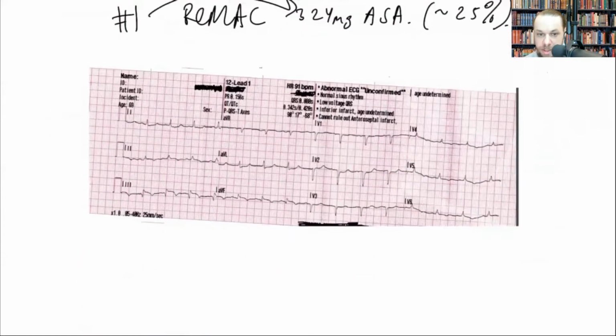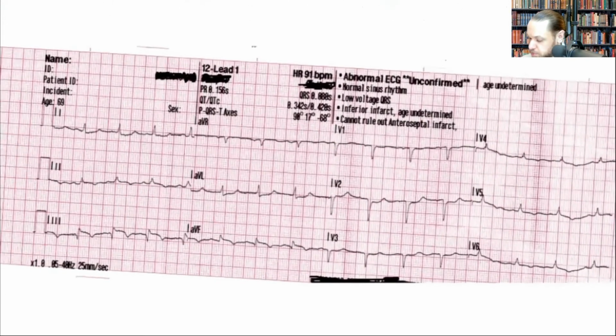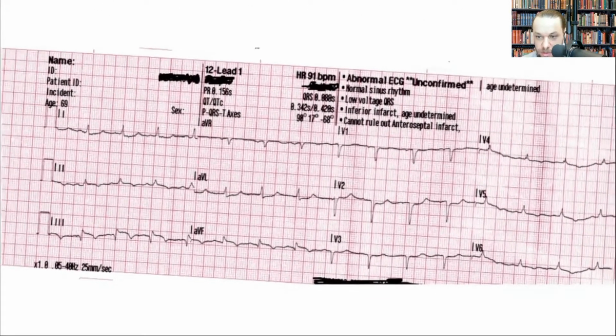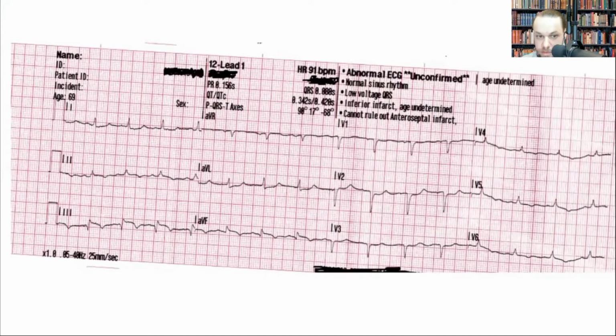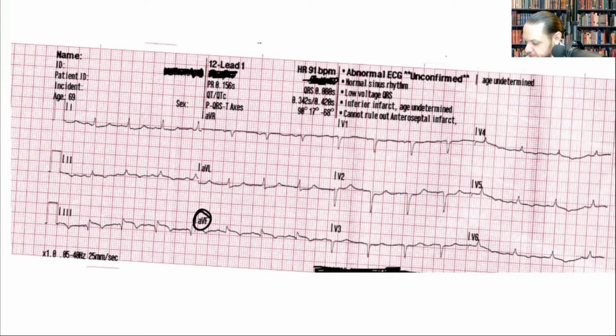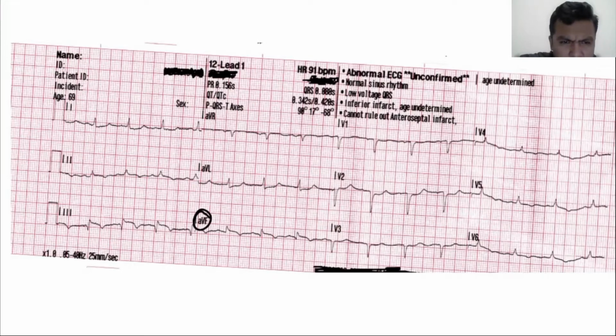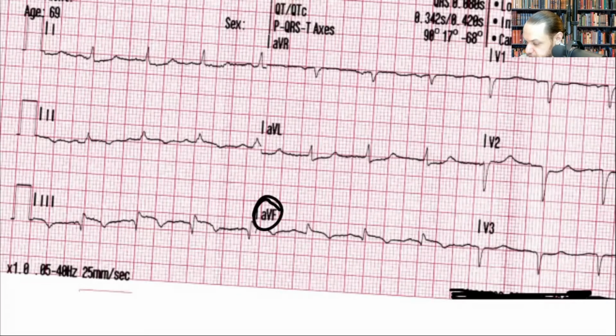Right. This was my 12 lead EKG I did in the field, right? Let me ask you guys, what do you see here? There's elevations in aVF and on the 4th lead. Okay. You said V4? So let me make it a little bigger. So truly speaking, let me make this like that. So look here.